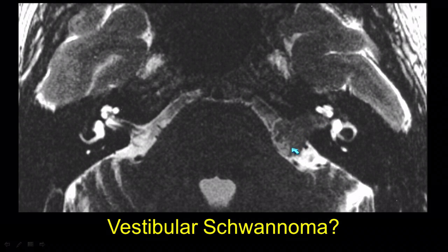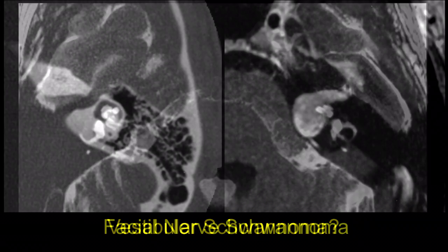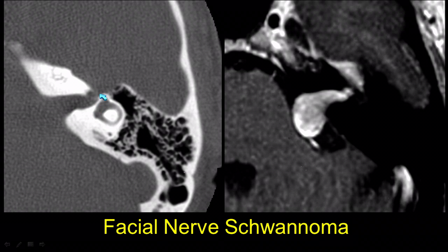And this patient had a pretty nice ice cream cone looking lesion. It's in the IAC and extending out to the CP angle cistern. They thought it was a vestibular schwannoma, so they went and cut this out. And postoperatively, the guy's face wasn't moving. And what they didn't notice preoperatively was that the labyrinthine segment was very widened, with enlargement of the geniculate ganglion, and we have avid enhancement along that course.